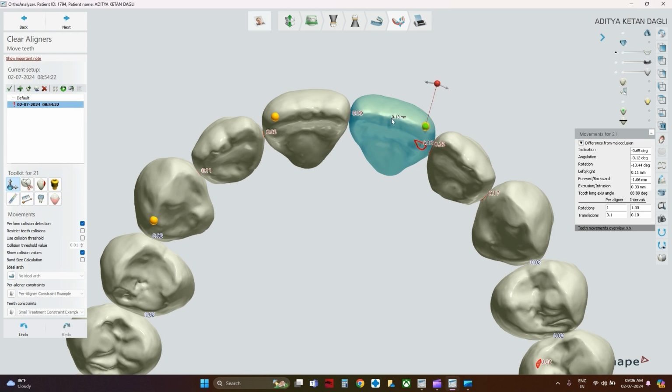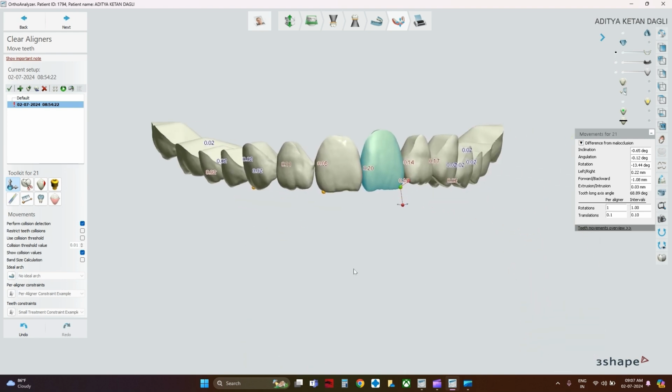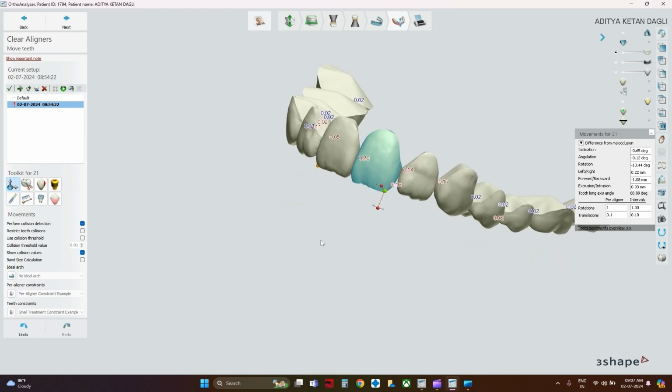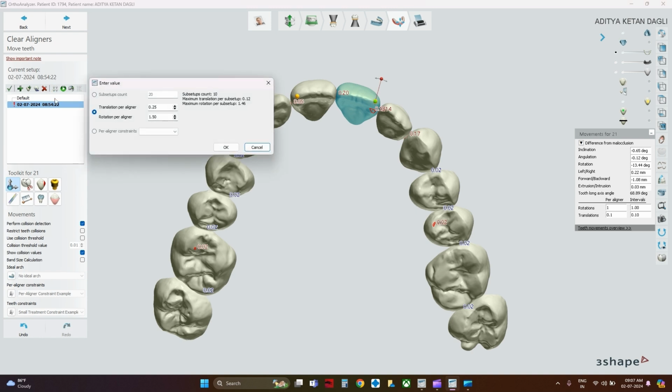So you can have a slightly tighter contact here, and so this could be our phase 1 where we achieve this with much more predictability instead of trying to correct. The beauty about in-house aligner is that you have total control over your entire treatment. So you can come here and you can check, okay, how many aligners is it showing with our conventional.